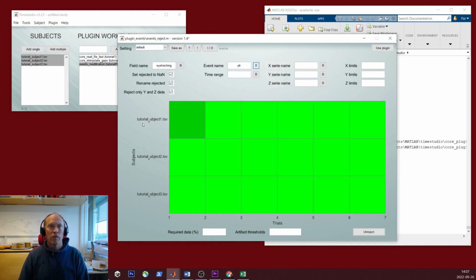You can see that all of the subjects have 6 trials. Now, remember that the white flash starts at 0.0, so we want to start maybe 1 second earlier and stop after 5 seconds. Then we can plot this by having time on the x-axis and the pupil on the y-axis.